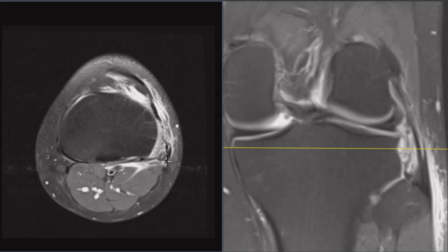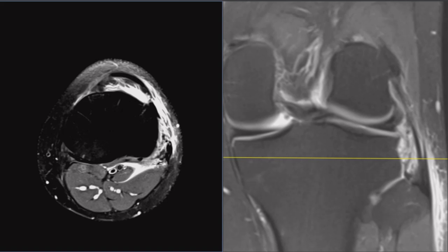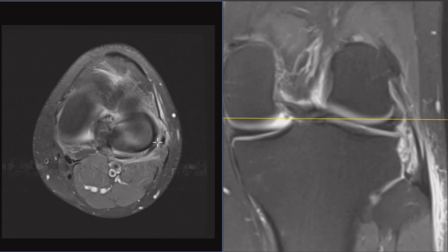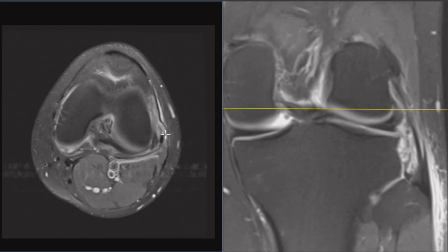Even in the best case scenarios, it's really hard to see, but there's a little horizontal line right there. I believe that may be part of the popliteofibular ligament that is torn and just ends right there, hanging out in the breeze. So they have tear of the lateral joint capsule and the popliteofibular ligament, but the other structures of the lateral side are intact.